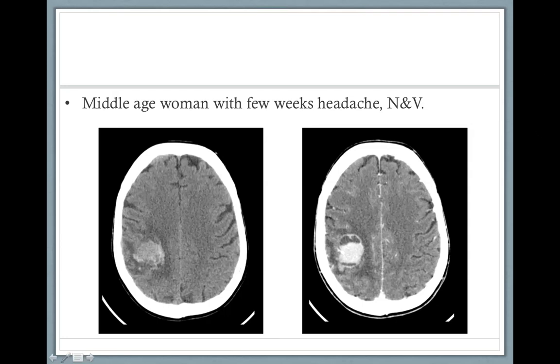So what do you think? For example, this is the falx cerebri. Yeah, somebody said more attenuation on the right. I agree. So this is the abnormality. We're going to talk about it, but let's take a look at the rest of the brain.